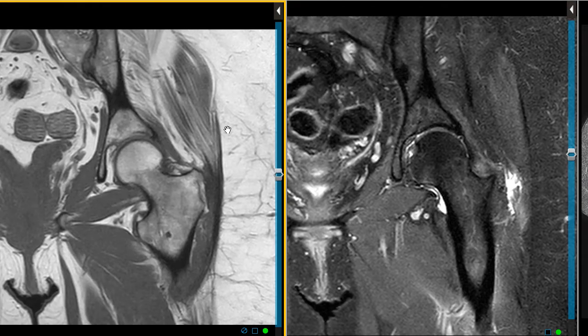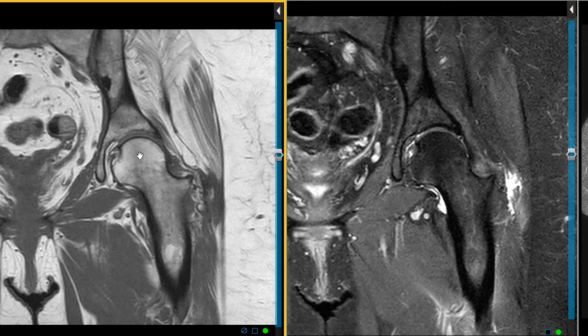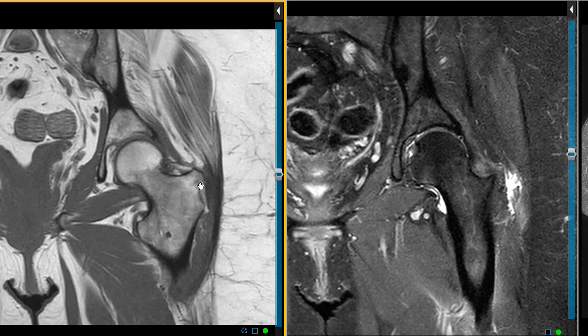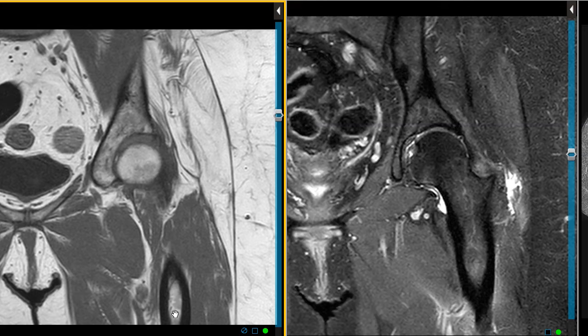To get our anatomy here, we see her left femoral head, which is round. It sits in the acetabulum, this cup here, part of the ilium, this big bone. We see the femoral head. Here's the neck that gets narrow. We have the greater trochanter here. This along the medial or inner side is the lesser trochanter. And here we see her femoral shaft going down the leg.